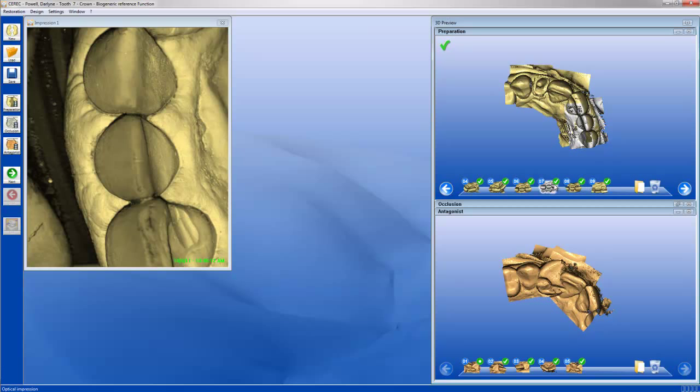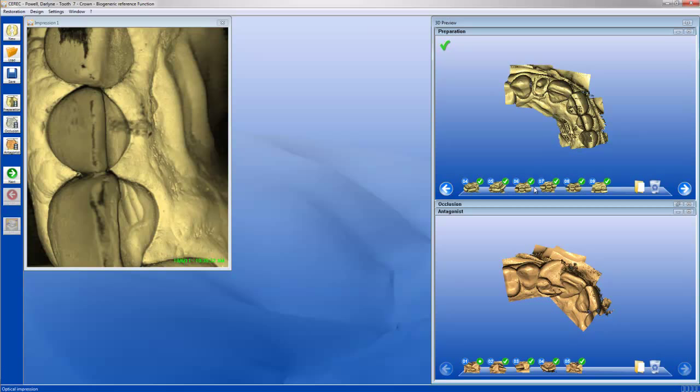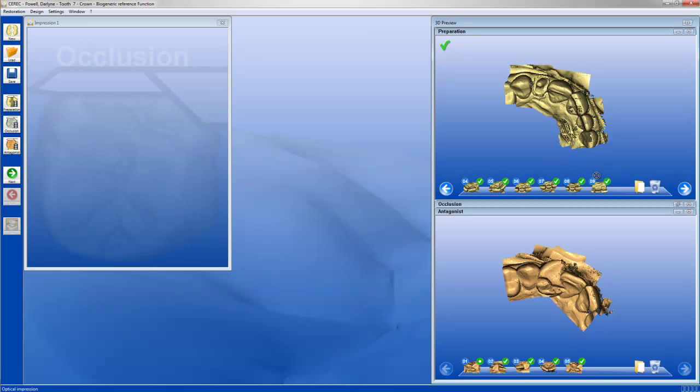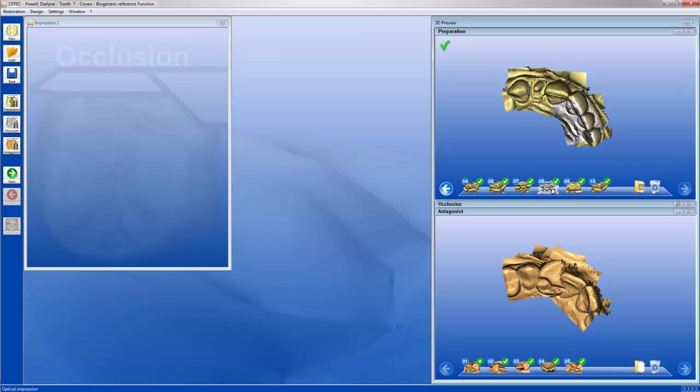Let's take a look over here. This is not so bad. Really, I don't see a difference between this and this. Probably a little bit redundant. I'd probably get rid of this. Let's see if we can get rid of it and not have it affect our proposal.